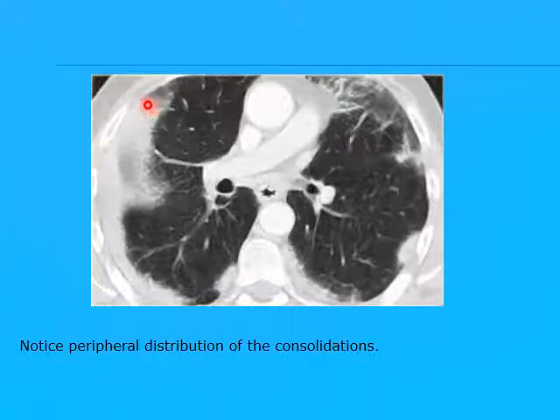That is what we say: areas, patches of consolidation or ground glass opacities affecting the periphery of the lung, sparing the central perihilar area. If this patient has peripheral eosinophilia, you can diagnose this, because this picture we will see in another disease in the coming part of the lecture.